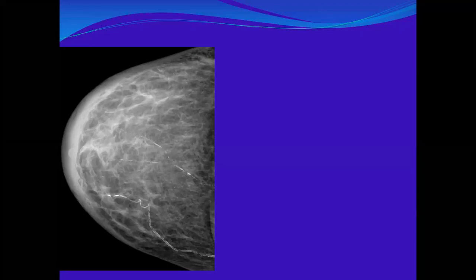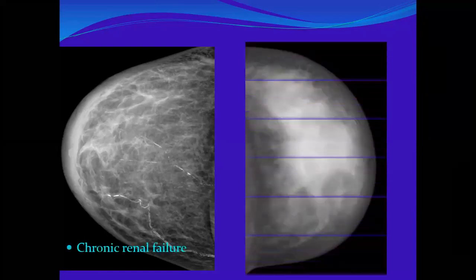Yes, Sarah, I was pushing you for the calcification. Why does this patient have calcification? She's still young, not diabetic. So this vascular calcification is a clue. This is the cause of edema: a renal or cardiac problem. This is chronic renal failure, you see?